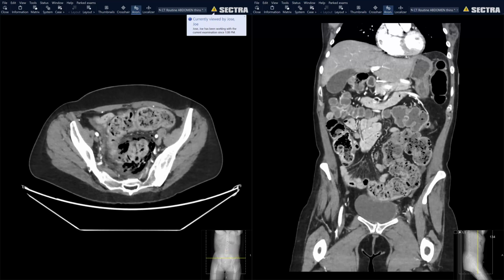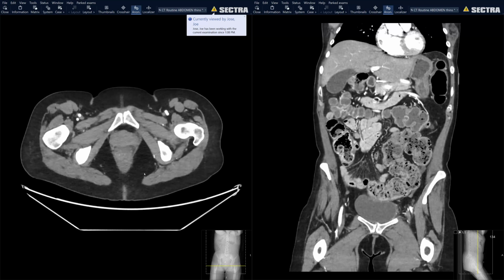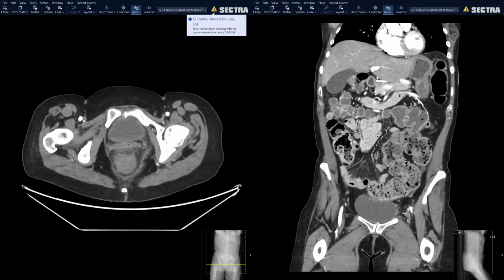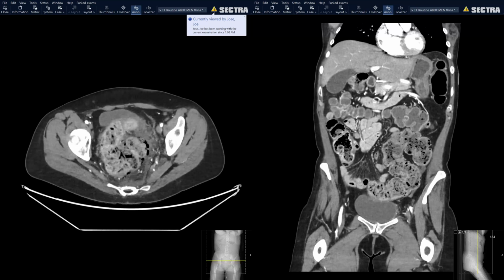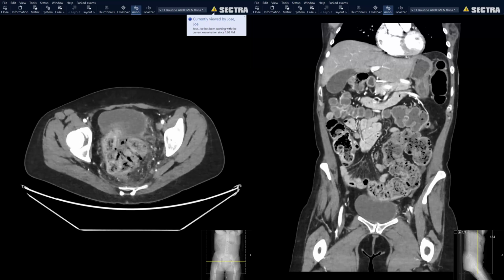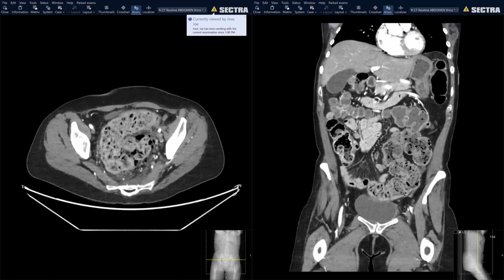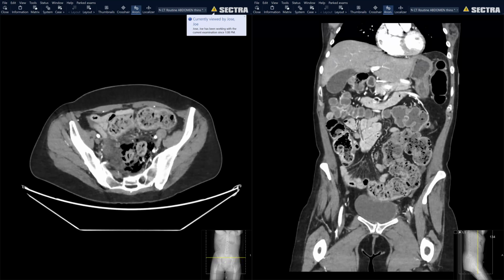Can you show the rectum again? Was the rectum ischemic? Because the wall looks a little ill-defined. I can't see the enhancement of the wall well. But it's interesting because usually with stercoral colitis, you see a big fecal ball impacting the rectum, but this one, I guess, there's just some kind of impaction leading to that rectal ischemia.